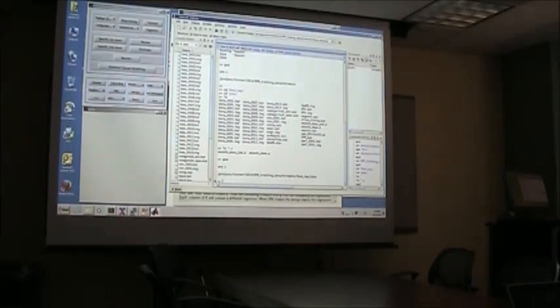But in any case, if you do the pre-processing, so if you do the co-registration, SPM outputs these files as a text file in the same folder where your images are. Okay. It's a file called something like RP underscore whatever your subject file name is, RP standing for the realignment parameters. Okay. Well, so it should be there. It's a text file.